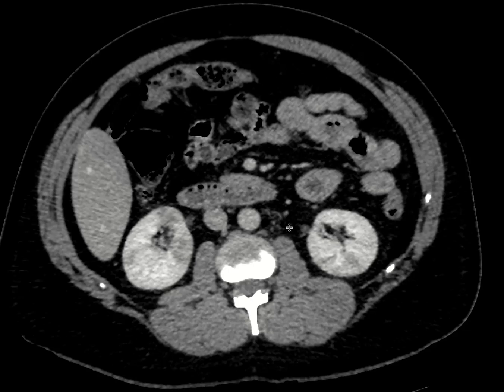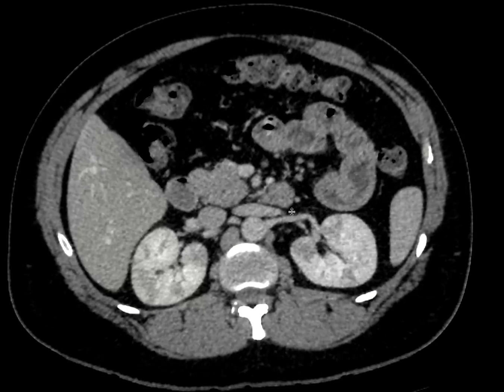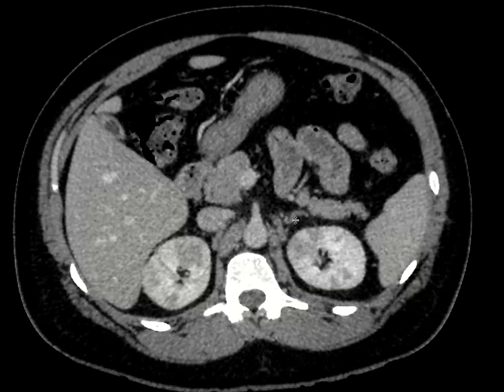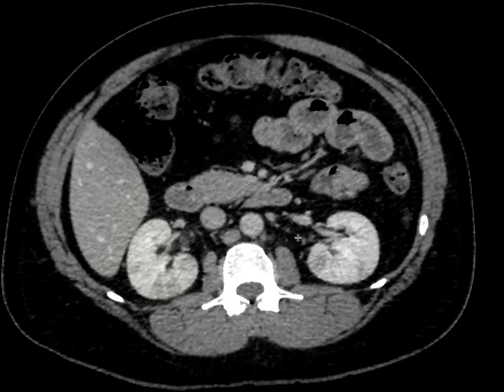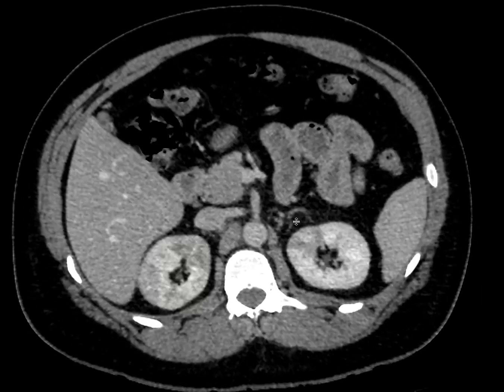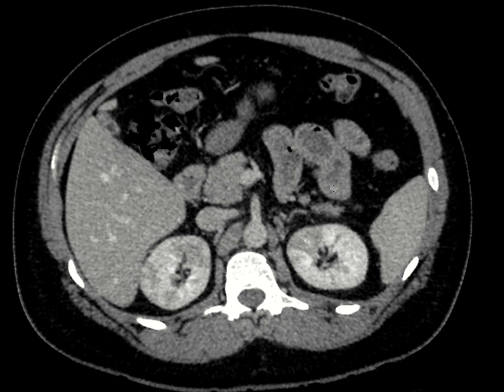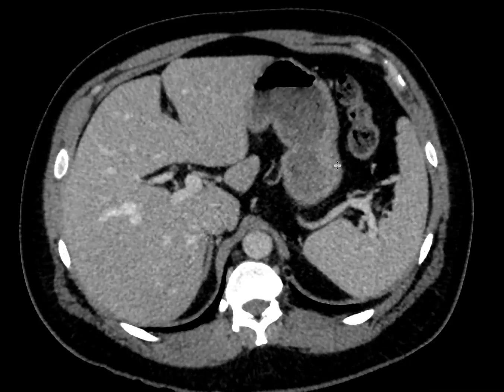Other things that can cause a striated nephrogram that we have to think about are acute tubular injury, sometimes leukemic infiltration or lymphomatous infiltration of the kidneys can give this appearance. But the other thing to think about is systemic hypotension, embolic disease, and intrarenal vasculitis.